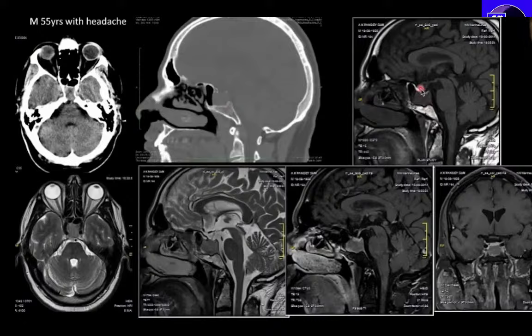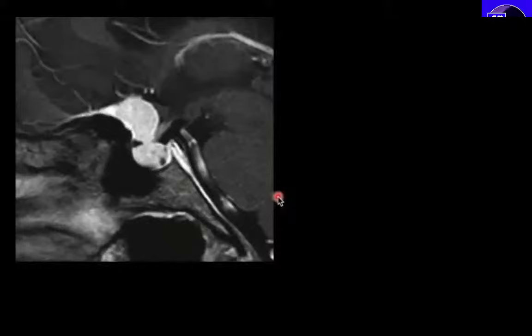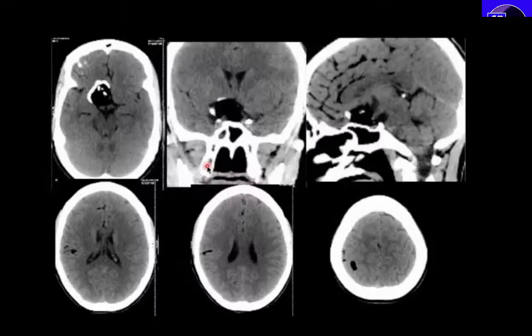Here we see that the adenohypophysis is enhancing separately from this mass, and the slight differential signal intensity is also seen on the T2 sagittal images. Here again we see that the adenohypophysis is enhancing differentially from this mass on post-contrast images. So this was not an adenoma. This was actually a meningioma, a sellar meningioma. This patient was biopsied through the transsphenoidal approach. Here is another suprasellar meningioma. The adenohypophysis is separate, and we are seeing the suprasellar meningioma with a classic dural tail.